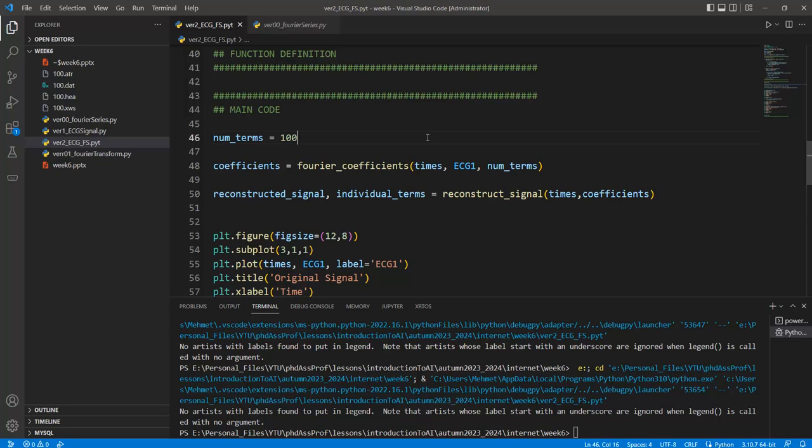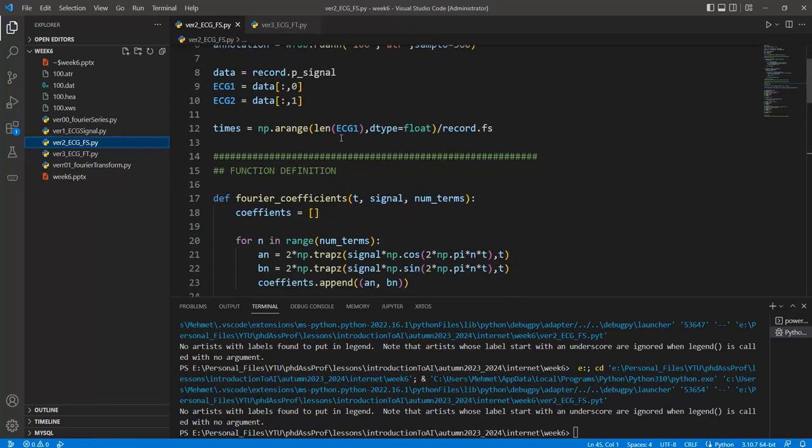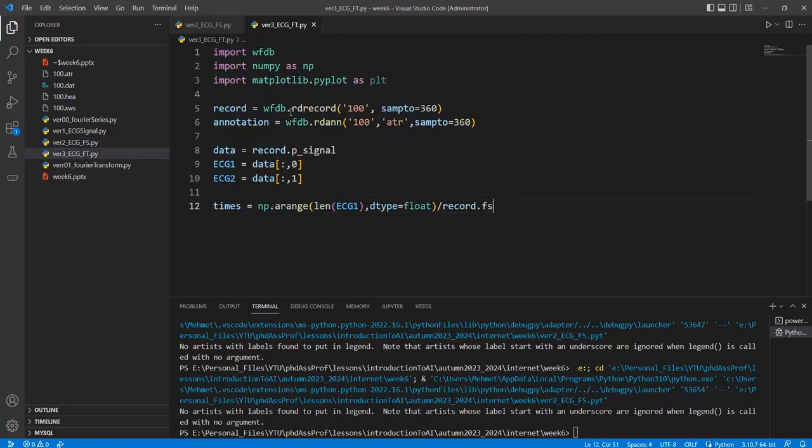But we also have the Fourier transform to be applied on this code, right? You can apply the Fourier transform as well in here. And so you can create the file ECG FT dot py. Okay, and this is not pyt, py. And in the first case, the same code can be given in here, like this one, right? It's the 1 beat.